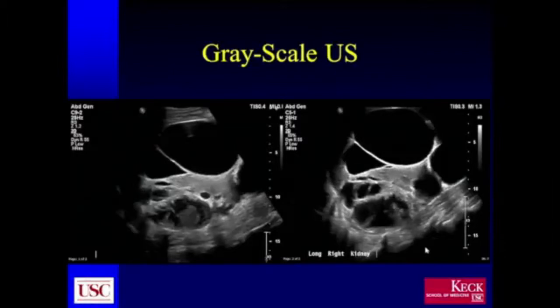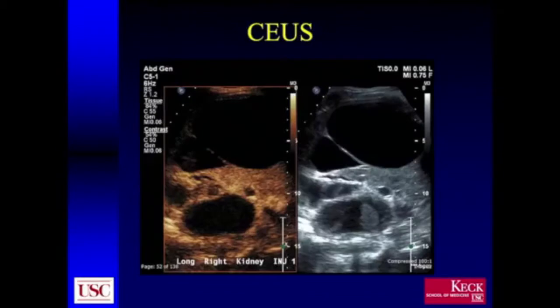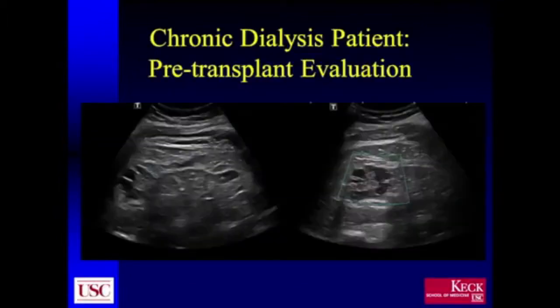The walls of this area of the structure are shaggy. So this was, again, further suspicion that there could be something going on here, but it was nicely confirmed as a hemorrhagic cyst on good old contrast ultrasound. You can see that within it, none of the solid material that we were seeing on the grayscale ultrasound actually proved to have vascularity, and this is the hallmark or typical picture of a simple hemorrhagic cyst in a polycystic kidney.